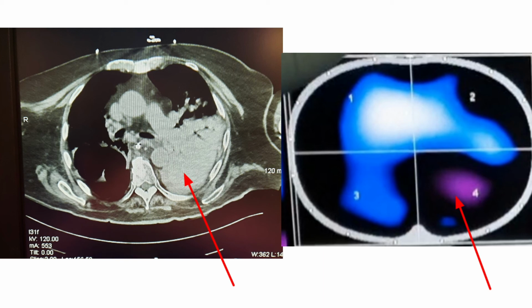So it's a combined effusion as well as the exudate that is being captured with the negative impedance values, interpreted here as purple. The black region of the CT scan indicates the area of aeration, and again, that correlates very well with the EIT, where ventilation appears in blue.